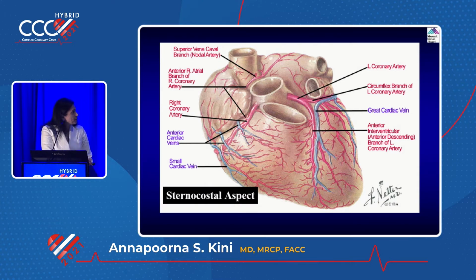So how is it separated, do you see that? You have the right ventricle, left ventricle, and interventricular septum. What runs on the surface on top of the interventricular septum is the LAD, and the right coronary artery goes this way, wraps around in the AV groove, and the PDA comes into the interventricular septum. That is why in the RAO view you see the LAD on the top and the RCA on the bottom.